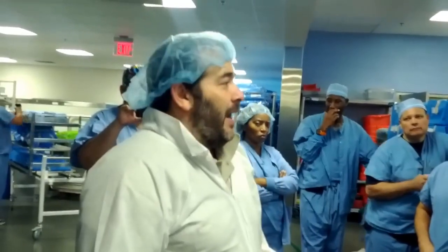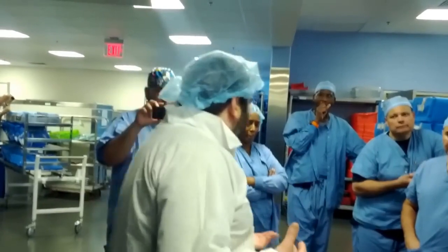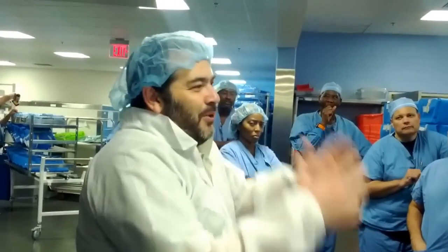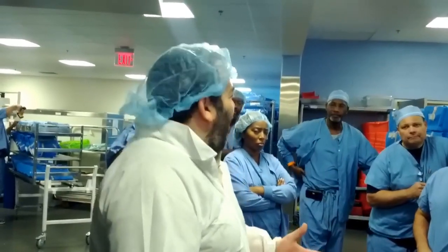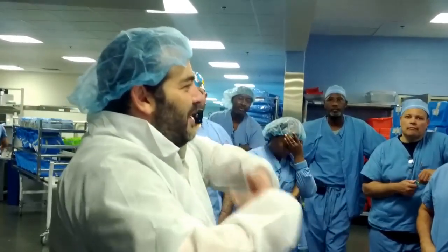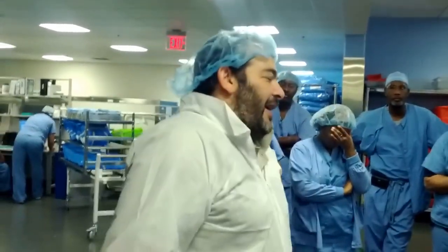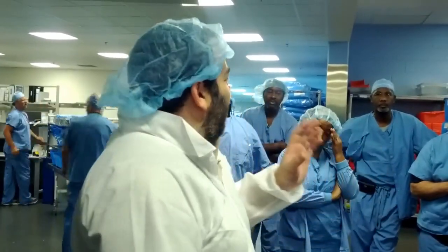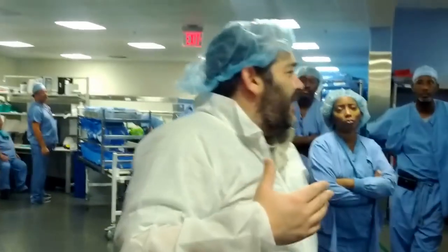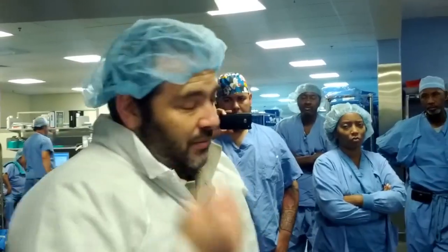What could happen to a package? It could fall. You could carry it in your hands, and you really shouldn't carry it in your hands. Even if you're not going too far, put it on the cart. And the cart has to be very specific. The cart has to have a solid bottom and closed doors, so while the wheels are turning, you're not dragging up anything into the package. Even that has to be special. We have to take that into consideration. What else could happen to a package? Temperature and humidity levels could change in the sterile storage area, which is where we're about to go.